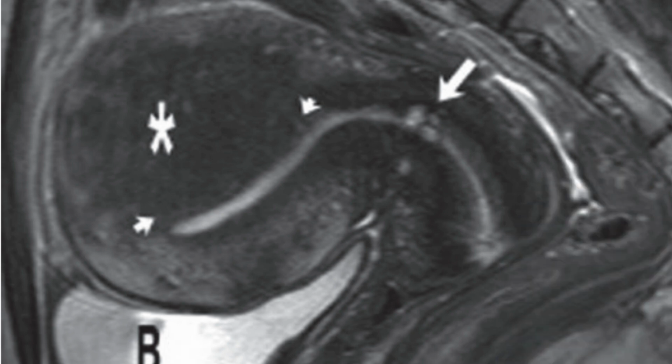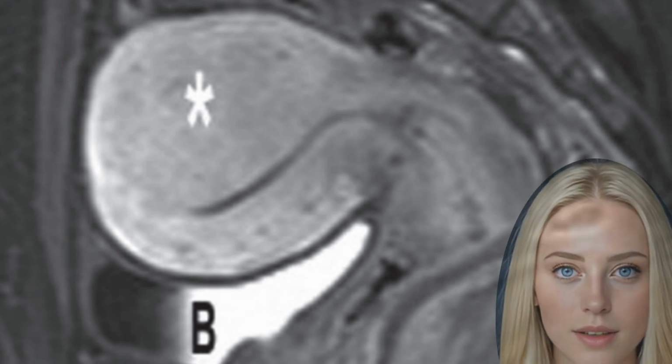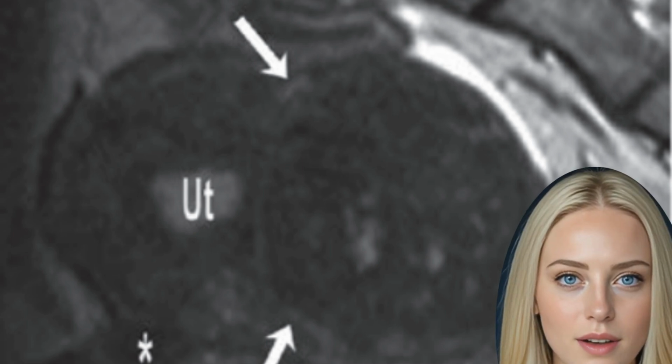Endometriosis. MRI is recommended in cases with suspicion for subperitoneal endometriosis or in cases with unclear dysmenorrhea and suspicion for adenomyosis. Subperitoneal implants of endometriosis. Subperitoneal implants from endometriosis may be detected with MRI from at least 7 mm in diameter.